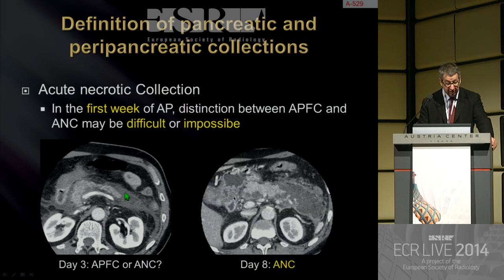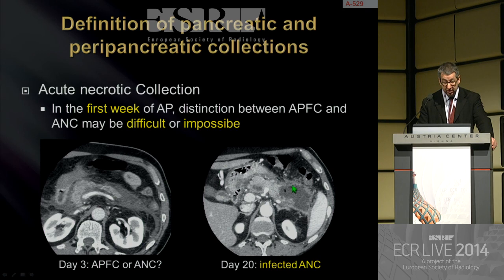It's day 3, and here it's day 8. At day 8, no doubt, it is not APFC. It's an acute necrotic collection. It's a necrotizing pancreatitis. And at day 20, it's an infected necrotizing pancreatitis due to the presence of gas here.